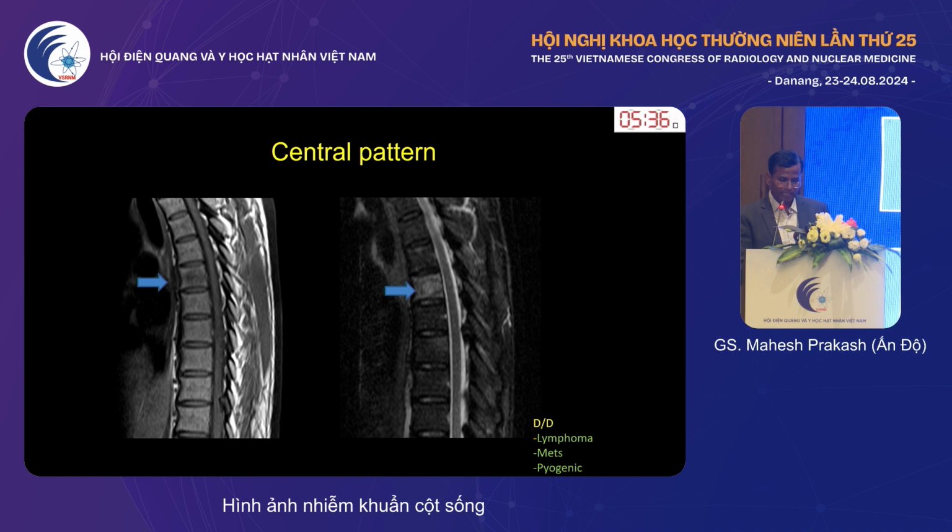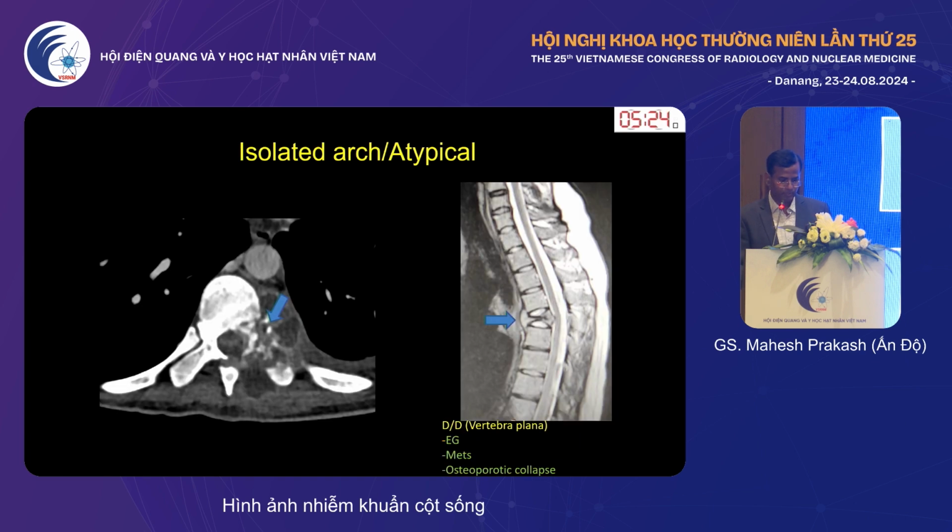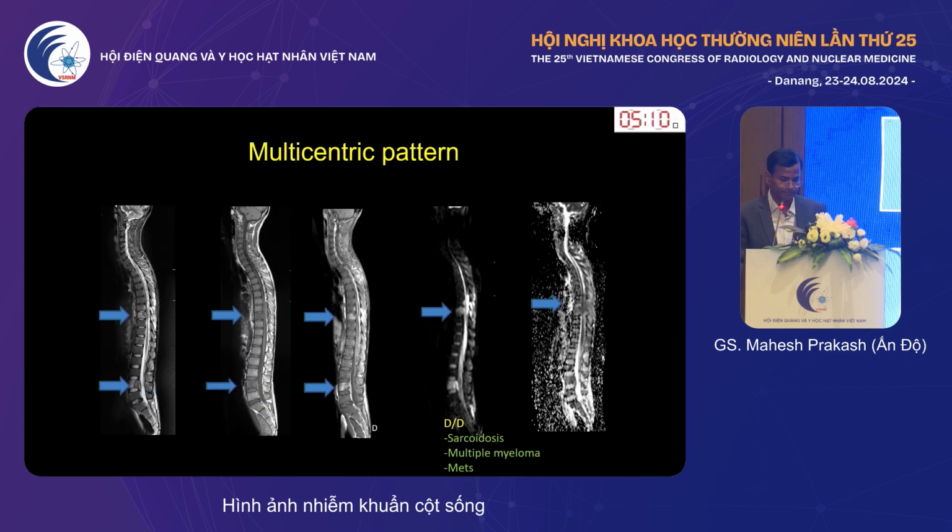Sometimes in cases of the central pattern, the lesion is confined to the vertebrae, not involving the paradiscal location. Paradiscal is more common, but sometimes you can find a lesion isolatedly involving the vertebral body, and in cases like here, the posterior elements also can be involved, and here isolated also. But these are quite rare. So the commonest is the paradiscal location and the subligamentous or anterior location.